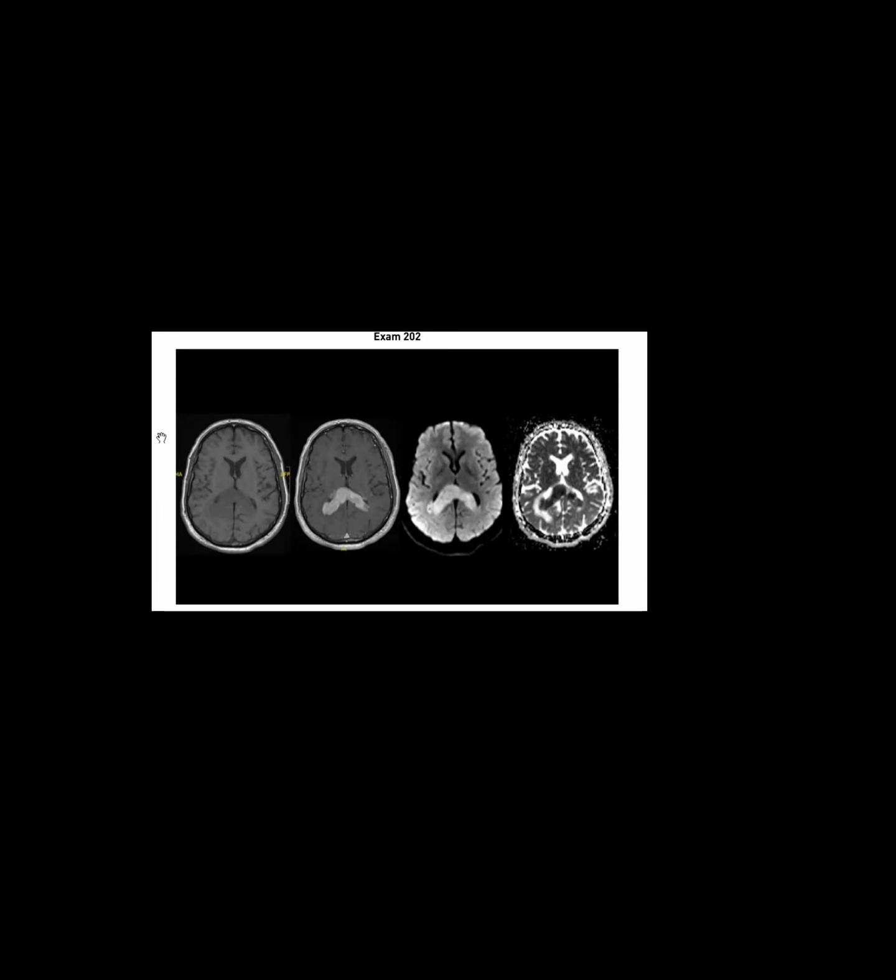So your localization is a little bit off. You said ventricles. This is a different area. What white matter tract is in the midline? What white matter commissure is in the midline, the biggest one? Cingulate gyrus is in midline. Corpus callosum. It's corpus callosum, yeah. So what part of the corpus callosum is this? The splenium. Right, so there's an enhancing mass in the splenium of the corpus callosum, crossing it, with restricted diffusion.